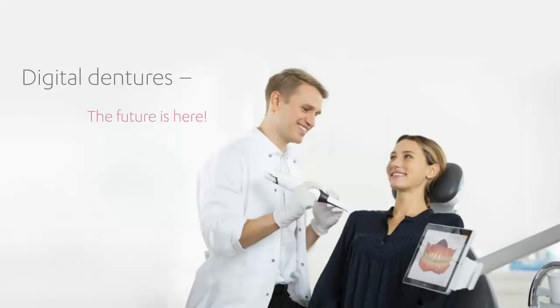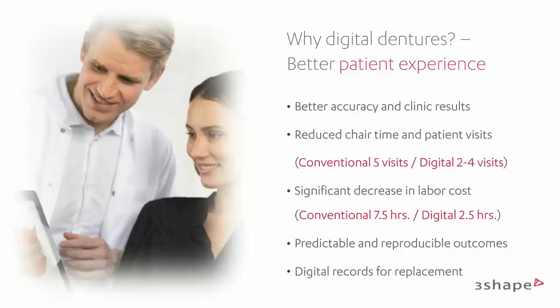So really cool. Then let's go to the real thing for today, which is the digital dentures. So the future is here. But let's start, why digital dentures? I mean, there's no doubt that it gives overall a better patient experience. There's also better accuracy in clinical results. There are dramatic time savings, so we can reduce the chair time and patient visits from classical 5 visits all the way to 2 to 4 visits, depending again on the indication and the workflow.